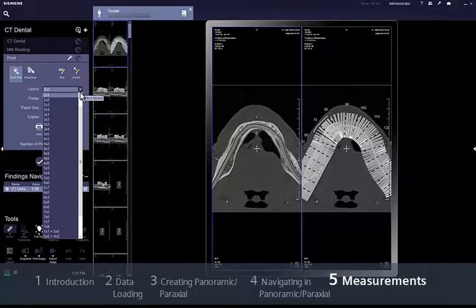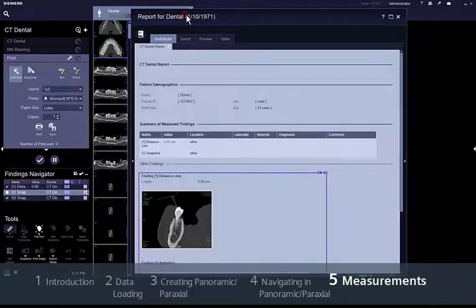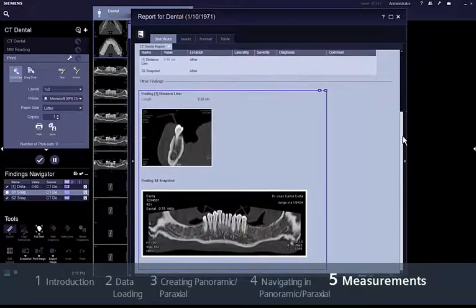Results are also conveniently collected in a report. To save and archive this report, the results series, and to complete the workflow, simply click the Save and Send button.